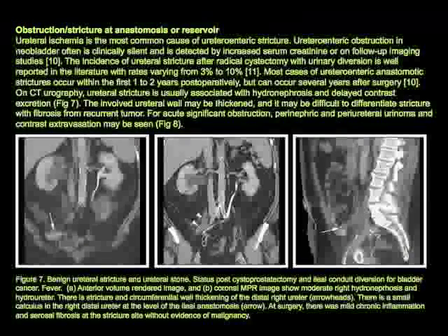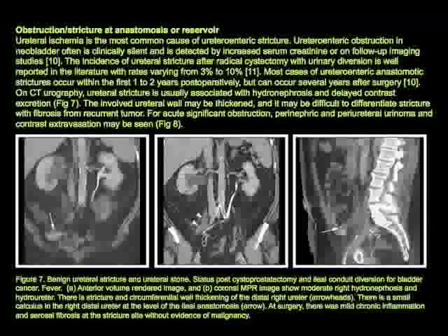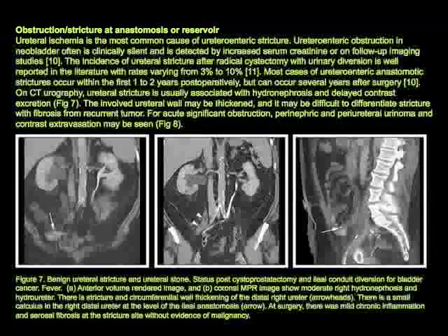Another case, stricture or questionable stricture. Again, you can see right hydronephrosis. Again, you can wait longer, but we've noted this before when we talk about CT urography that sometimes you can wait like forever. We know that from IVPs, and the ureter doesn't opacify. What's very nice about CT is the non-opacified ureter is really opacified with urine when it's obstructed, and you can very nicely see the transition, and particularly when you give IV contrast, that transition point does enhance. So it works out very nicely in that regard.